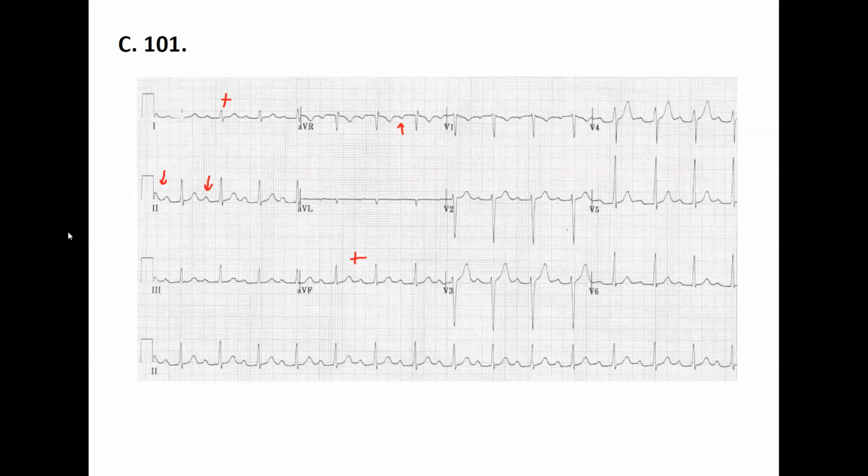Now let's evaluate the PR interval. The PR interval is big. I calculated something like 0.34 seconds, I think. It's almost 0.3 seconds. You can see that. So it's more than 0.2. What is your diagnosis? For me, it's AV block, first degree AV block. Good, very good.